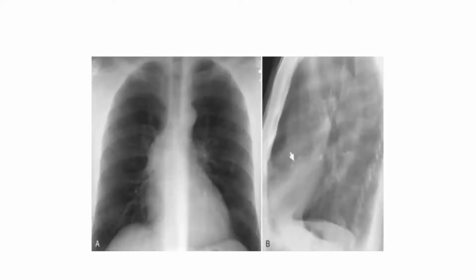Okay. And again here, there is also calcification. And if you drop your imaginary line, it's falling above. So this is aortic calcification again, less than the one I showed you before. But if you look here, do you appreciate any aortic calcification? Not really. This X-ray is the lateral X-ray of this same patient. And this again emphasizes the importance of the lateral X-ray when you are looking for calcification. All types of calcification probably are seen better in the lateral than the AP and PA view.